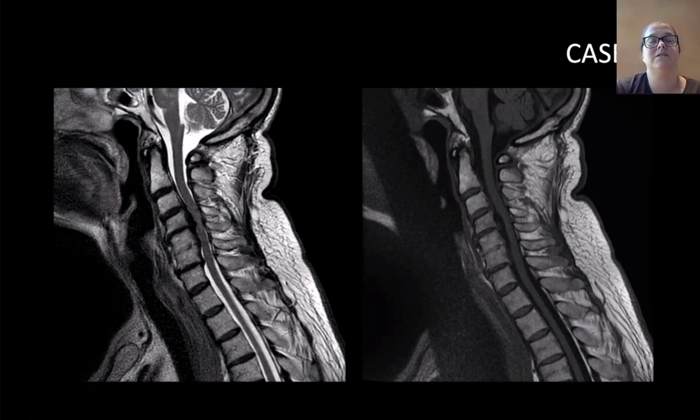Just keeping in mind in the cervical spine, often you've got osteophyte as well. You can differentiate if you have an axial gradient sequence. You can sometimes differentiate what part is disc, what part is osteophyte. We used to always get an axial gradient, and then for time's sake, because we're so behind, we have excluded it, except we do in trauma cases. In the cervical spine, a lot of people will just say disc osteophyte, but they'll still say if there's a more focal finding, like a herniation, you can use the same terminology in terms of the location.